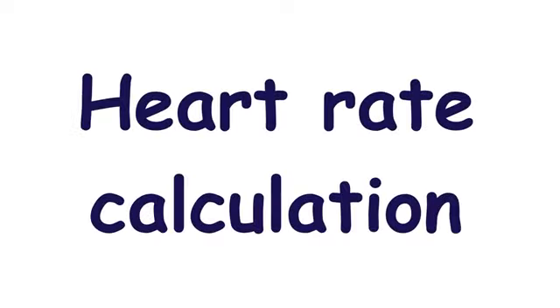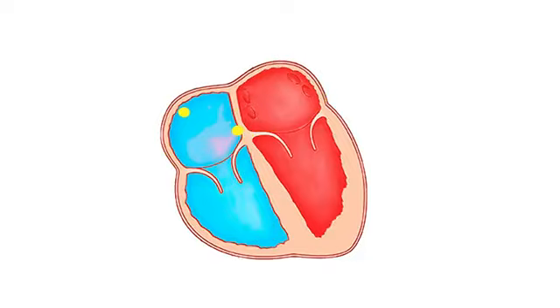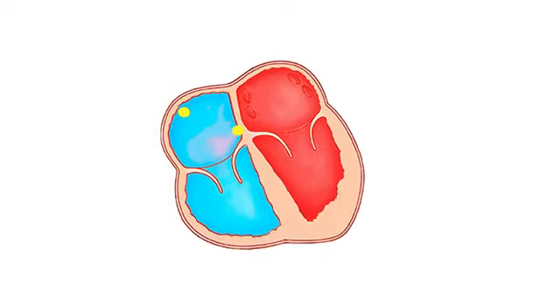In this video, we will speak about heart rate calculation by ECG. There are a few methods of heart rate calculation. The square counting method is very easy and it doesn't need any difficult calculation.